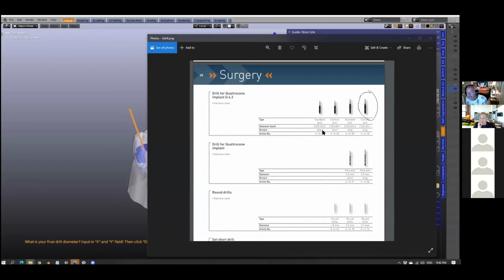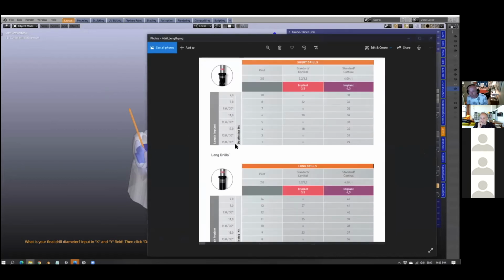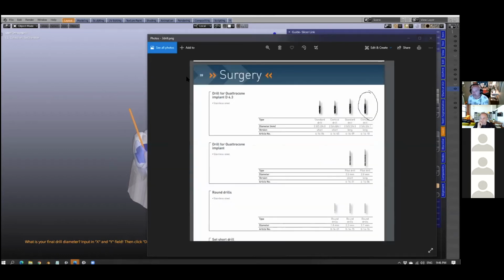So they've got a system where you choose on the drill, they've got a drill depth stop number. I wish someone here would know, but I don't really know. So these depth stop numbers, on the standard drill, there's numbers on them. But for now, I just wanted to inform you guys how that works.